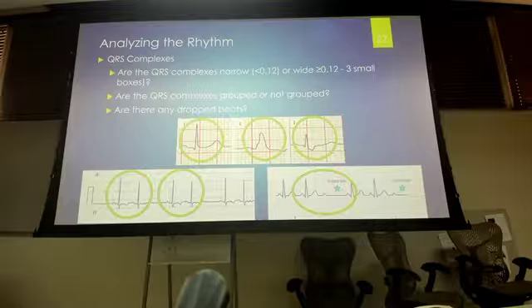I've got something here. Now, some of you may be like, well, how do I know that's not a U wave? Because if you were to measure this out, okay, and you say, I got a P here and I got a P here, well, guess what?